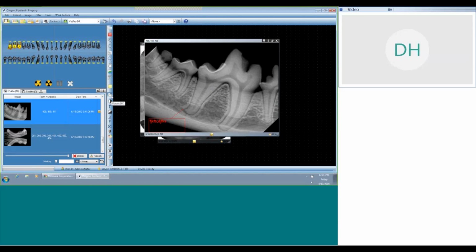It's going to save the image however you closed out the software. It's also going to keep that original image too. So you can always go back to the original and you can always keep and review the filters that you've applied as well.